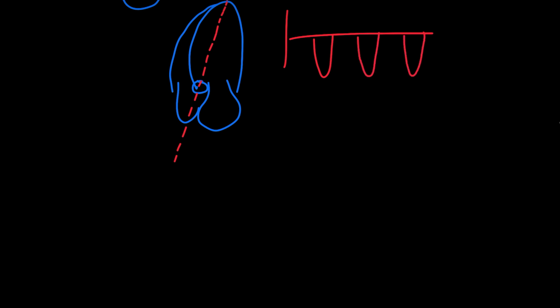velocity in meters per second over time in seconds. And let's say that our Vmax here is 4 meters per second. And let's say that the velocity time integral, or VTI, the area under the curve, is 100 centimeters. We can similarly use our pulse wave Doppler to measure the velocity, not along the whole line like we just did, but right at this point, right at the LVOT.